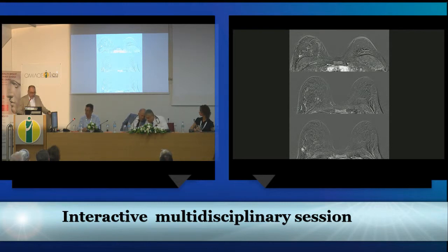So with MRI, would it be easy for you to interpret the images here? It looks like there are some enhancing foci, and obviously on the bottom image, I would say the appearances are quite worrying. So, how long after surgery was the MRI done? It's 1 or 2 weeks after. Okay. So, yeah, well, I would be worried.